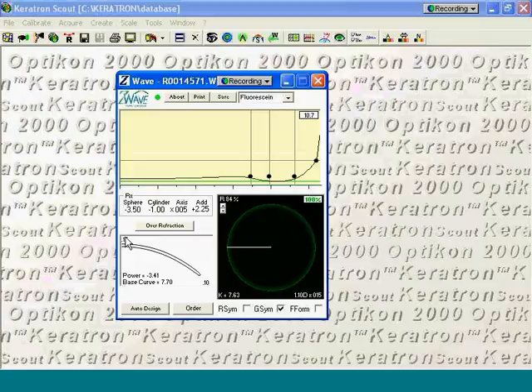The center thickness is generally minimized, but it's always a good idea as the last step to always choose your minimum thickness and let the program calculate for how thin the lens can actually be. Edge thickness can also be varied. I personally like a very thin edge, but there may be occasions where you want to use a thick edge.